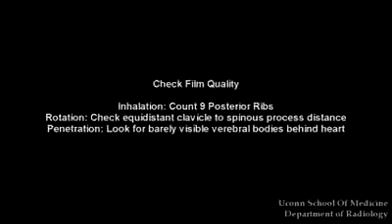Let's run through reading a normal chest X-ray. First thing, ensure that you have the correct patient film. Make sure that the patient's name, date and time the film was taken, and film ID number match what you're looking for. Do a quick survey for technical quality. Look for proper inhalation, signs of rotation, and correct penetration.